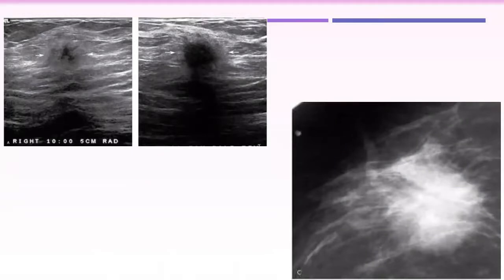She doesn't do the biopsy or whatever, and she comes back after many months with the lesion resolving. What does it mean? I downgrade this lesion. Significantly resolved within months. So what could it be in your differential diagnosis, presenting like this?